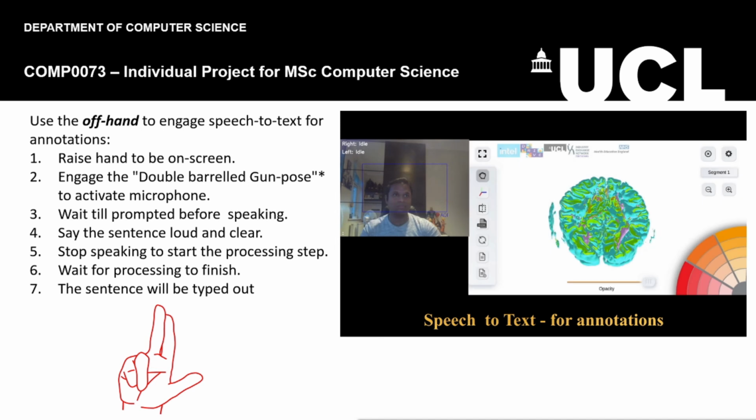And there you go, the speech-to-text translated that on screen quite nicely. So currently I'm using Google's speech-to-text API via Python's speech recognition library. However, ideally for clinical applications like mine, I can find another API or model which can suit the privacy requirements of my application. And that concludes this video.